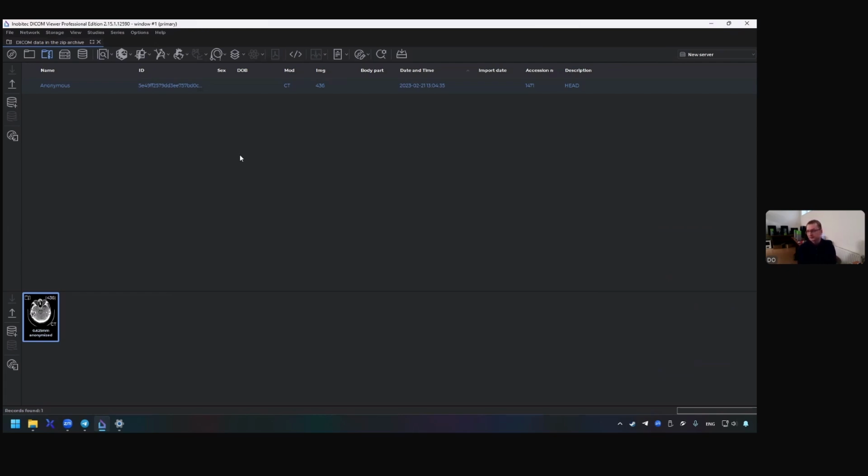In I think 80% of cases, closing of a unilateral defect is needed, and it could be achieved using skull mirroring. And in Inobitec DICOM Viewer, we have the possibility to make a mirrored series, a relatively fast technique.